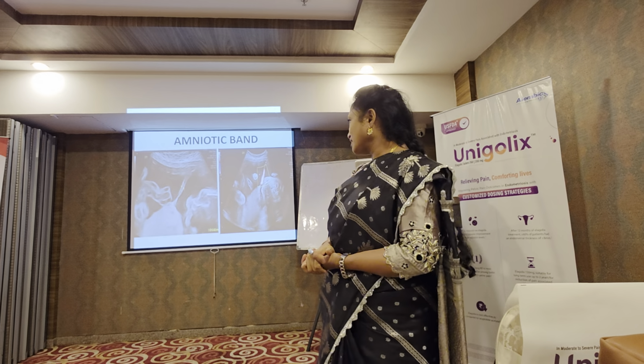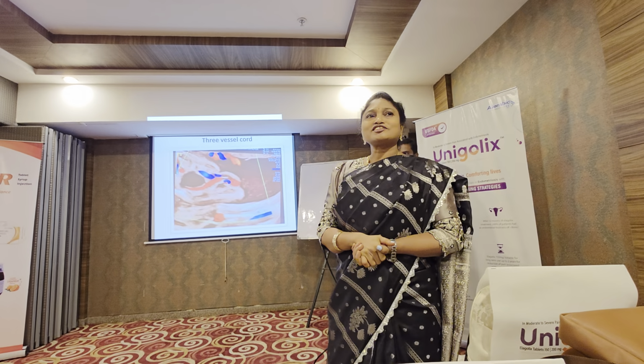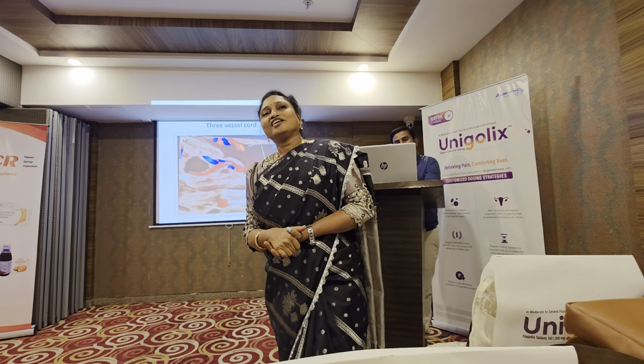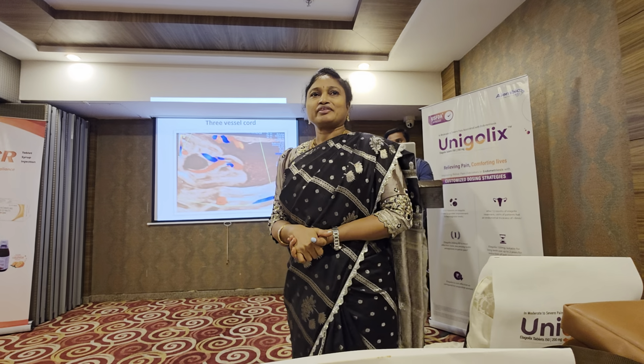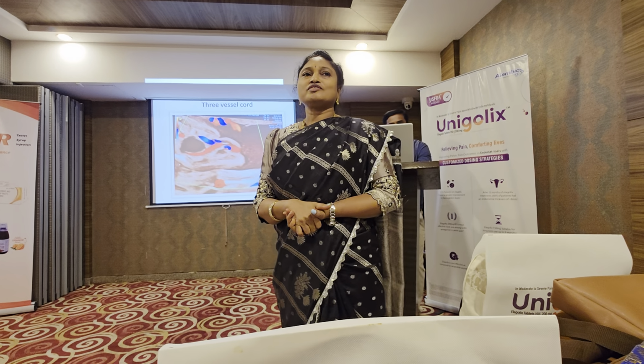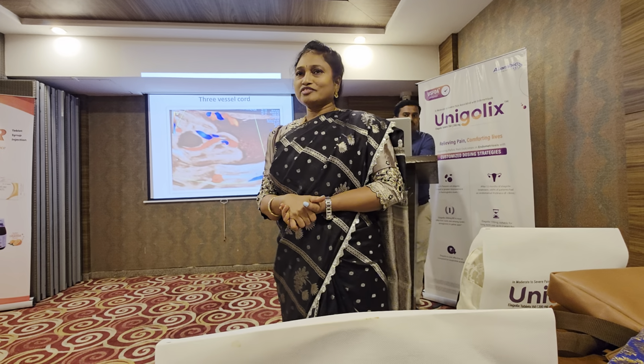Next one. Actually, that is one way where you can save yourself in case you have not diagnosed a missing limb and the baby is born with one digit absent. You can always say it may be because of the amniotic band.